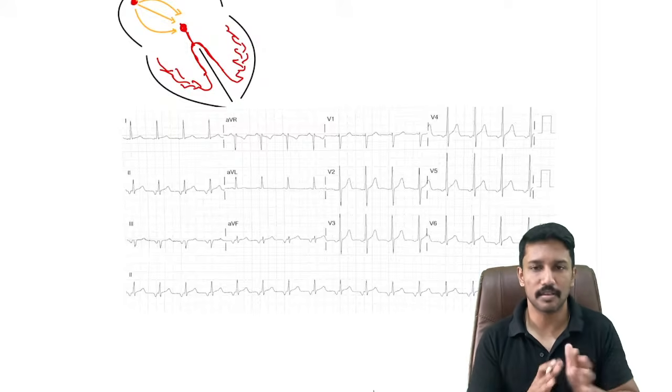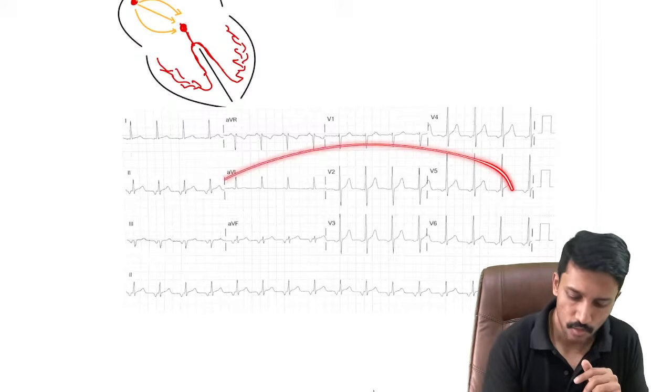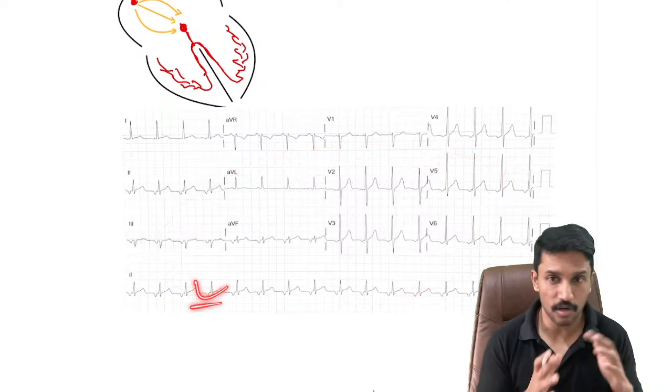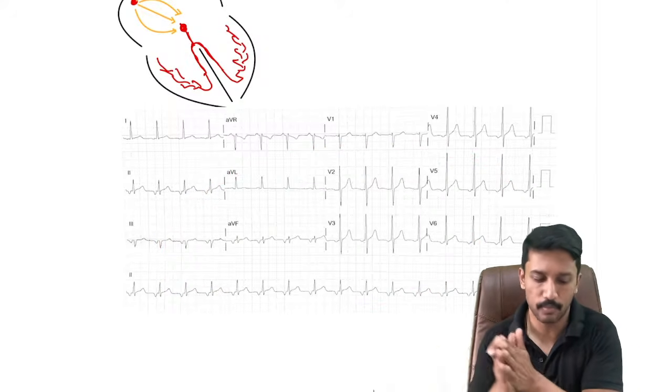This is some arrhythmia. Now we will learn how to identify those arrhythmias. We have seen two ECGs. This one we counted as not being normal sinus rhythm because of inverted P waves, not morphologically normal looking P waves.